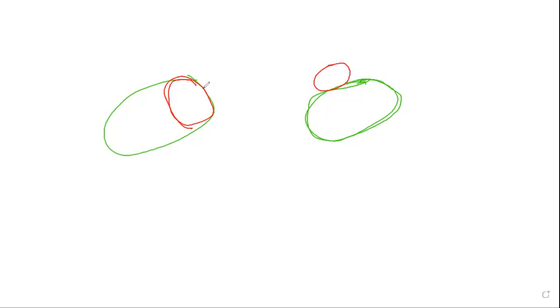So when the cyst is within the ovary, we would see ovarian tissue around it. This part of the ovarian tissue around it is called the claw sign, as if it's opening its claw and engulfing the cyst because it's around it. Or the beak sign, just like a bird's beak opening its mouth and engulfing it. But here we don't see this claw or beak because the ovary is essentially outside the cyst.